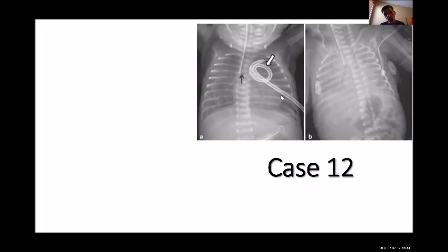The right side of the heart looks okay. I can see it. Okay. I don't see asymmetry; the lung is symmetrical. And also I see subcutaneous emphysema, probably due to insertion of the chest tube in here and in here. Okay. So this is an early film. Now you can see the tube is still deep. Okay. But the X-ray position is not correct.